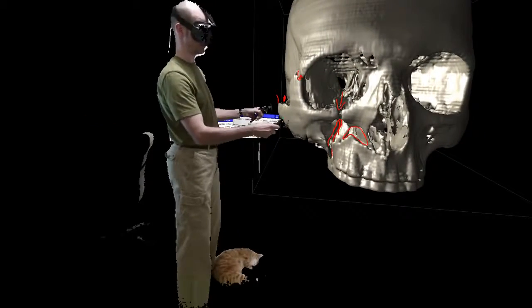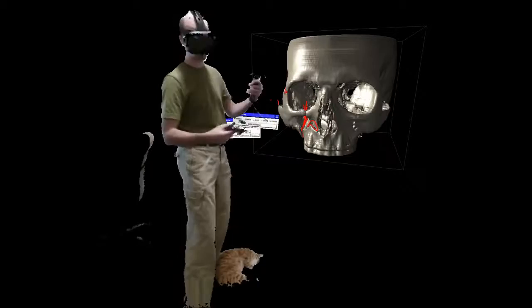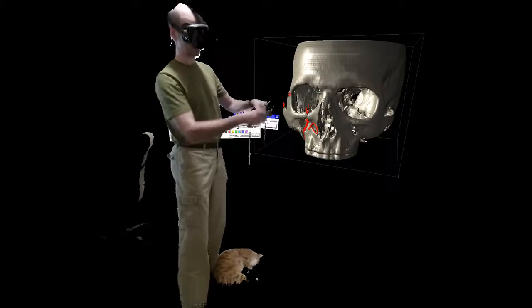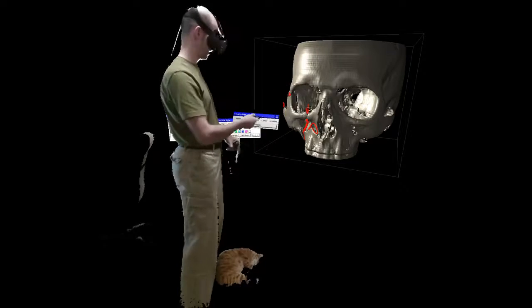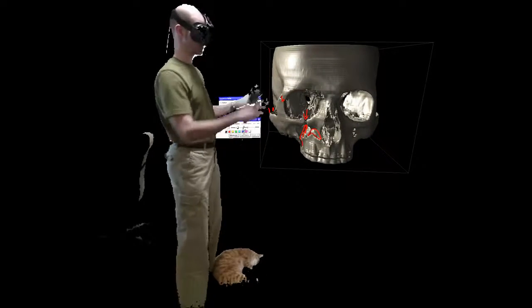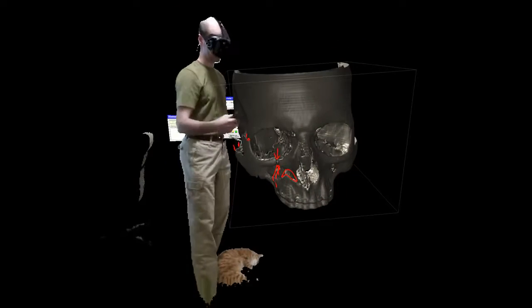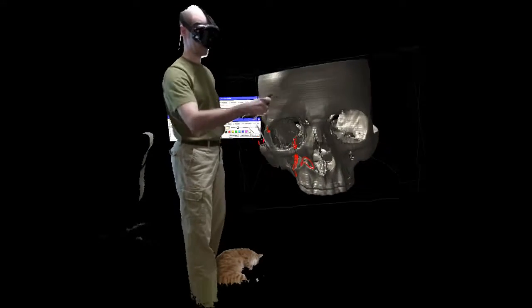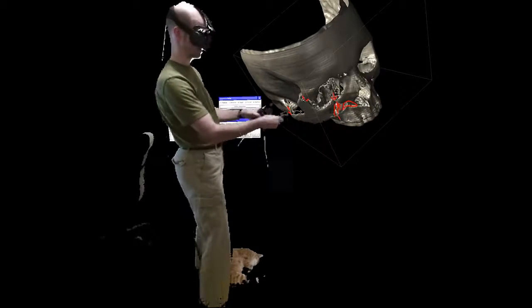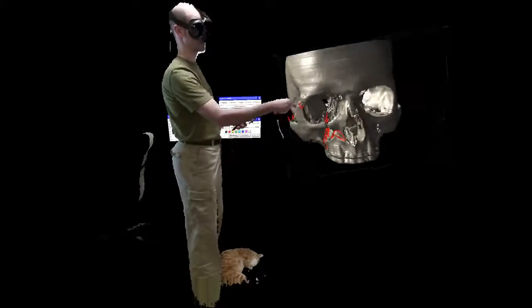And the useful thing about 3D Visualizer, or generally about looking at 3D volumetric data in a VR system, is that we can look at it in this three-dimensional sense. Because we are not projecting the 3D data onto a screen, we're looking at it in physical space. We don't have any distortion, there are no angles that are distorted, everything is correct. This angle that I measured to be 107 degrees looks to be 107 degrees, distances appear correct.